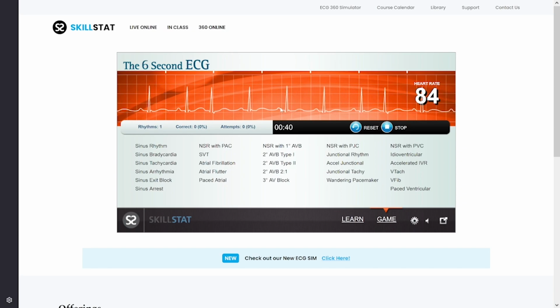So we can see here that we have our P waves here. But sometimes we don't really see our P wave. What else do we see? We see our QRS complex is nice and tight. The P wave matches with the QRS each time. They're spaced out in a weird way. So I'm guessing that this is a sinus rhythm. But what's going on? We have these beats that don't seem to have a P wave every time. They have a T wave though.